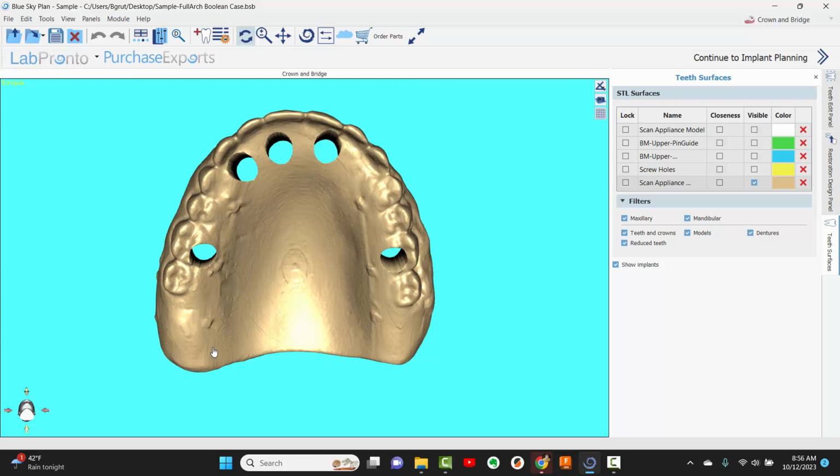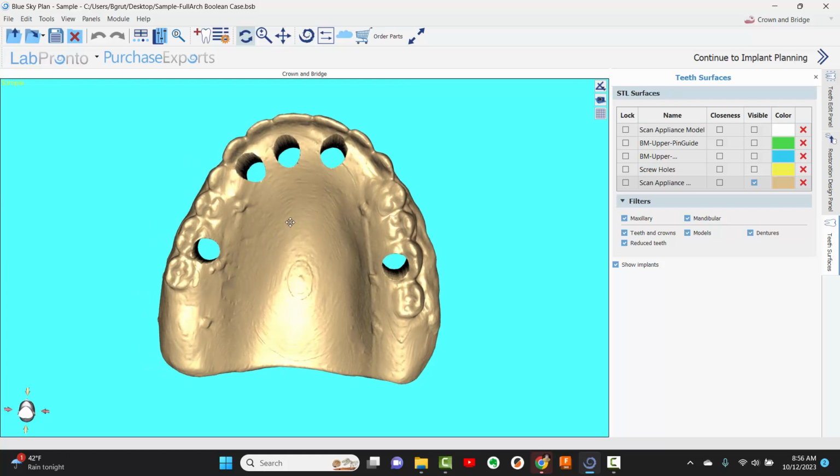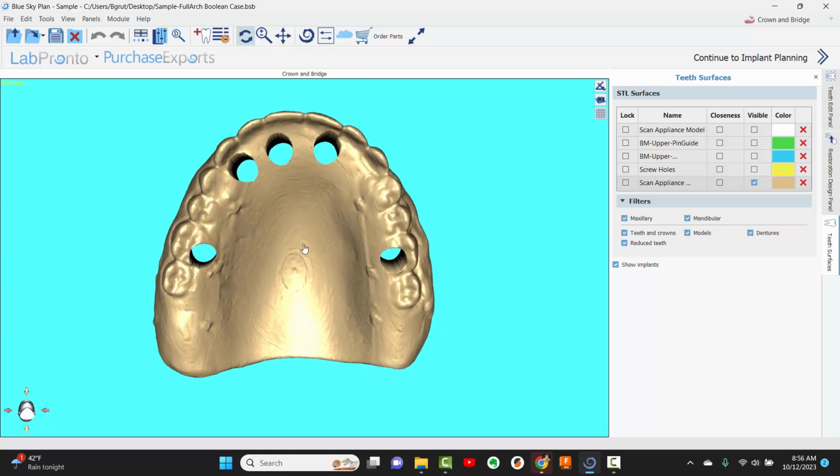I'm recording a tutorial video and we're at 7.5 minutes. That just shows that this whole process is about 2 to 3 minutes of work, and creates exactly what we're looking for. So anyway, I hope this is helpful.